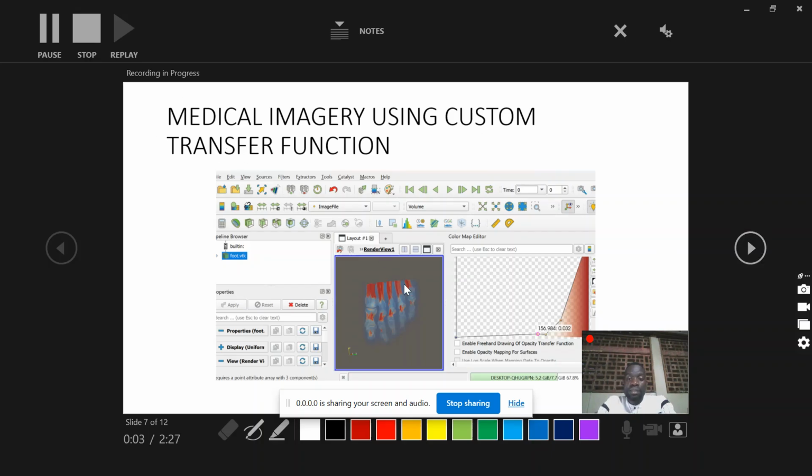So when I come to the color editor, I reduce the color enhancement, and I'll try to get the bone, the internal structure, how the bones look like, the color concentrations, the thickness of the bones, of each bone probably. So here I can determine the nature of the bone, the size of the bone probably when I remove the scale.